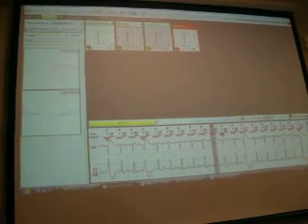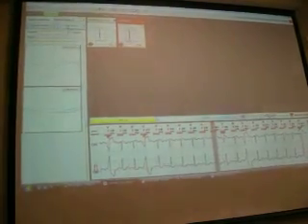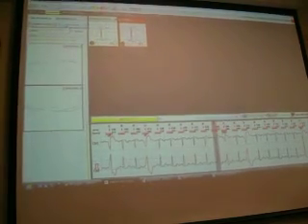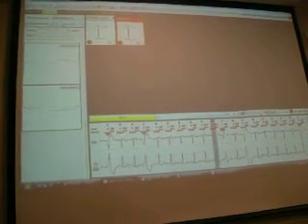When I'm ready, I'm finished, update changes, and I use the auto merge function. Auto merge means that the software is merging the similar clusters into one cluster.